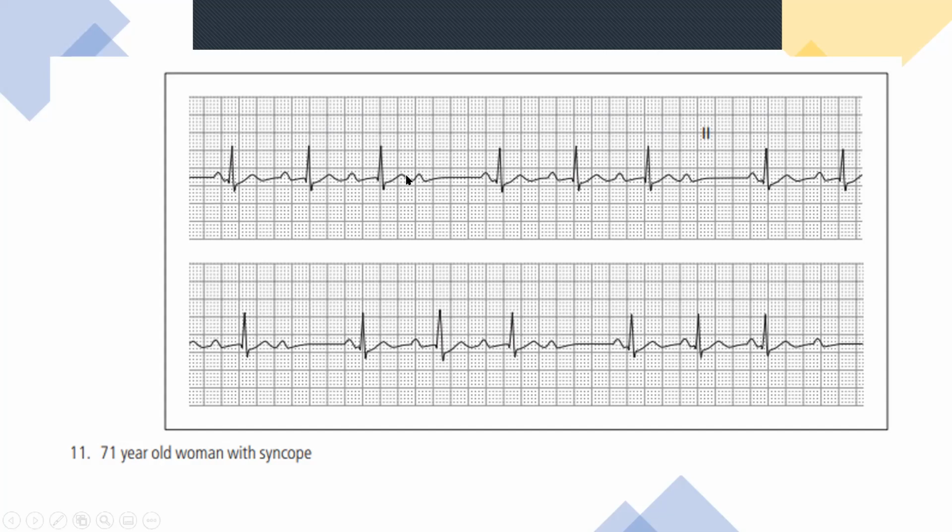the QRS complexes. So the first thing is in a complete heart block, because there's no relationship between the P waves and the QRS complexes, they tend to be wide. So normally, once you get thin complexes, you can sort of rule out a complete heart block. So that's when we get to the interesting part, which is where a lot of people get mixed up, and they often forget which one is which.